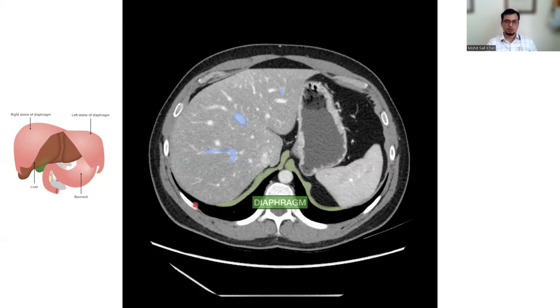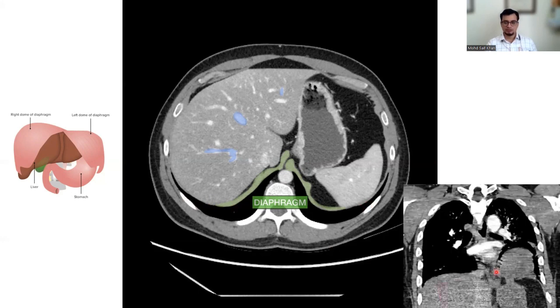So usually the posterolateral aspect of the hemidiaphragm is ruptured, and there is a collar sign sometimes you can see, okay, or the hourglass sign, especially in the coronal view, where you can see the herniation of the viscera through this diaphragmatic aperture into the thoracic cavity, pushing the lung bases upward, okay, or even the mediastinal structures upward, so that you would be able to see better in the coronal view.